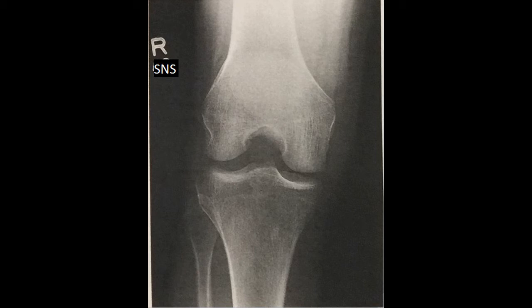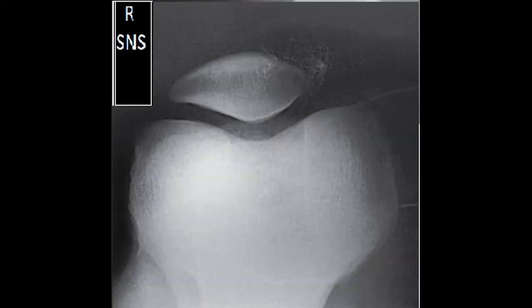And you can see the soft tissue and bony trabecular detail of her knee, and you can see that the central ray was perpendicular to the long axis of her lower leg. It entered 1/2 inch below the patellar apex, and you can tell it looks pretty centered in that area just by looking at this image. So I would send this image off too. This looks great.